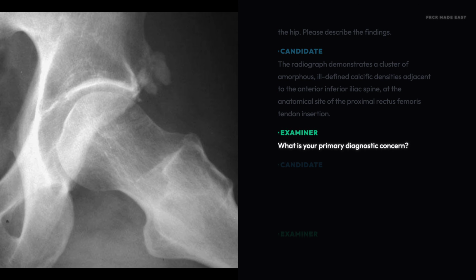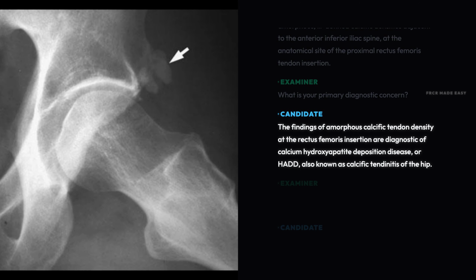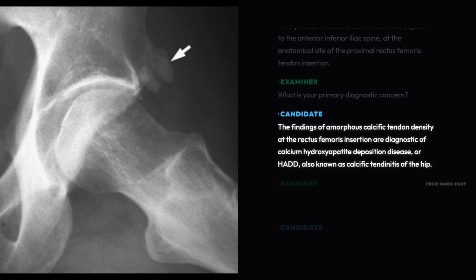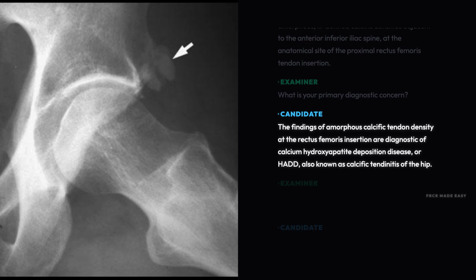What is your primary diagnostic concern? The findings of amorphous calcific tendon density at the rectus femoris insertion are diagnostic of calcium hydroxyapatite deposition disease, or HADD, also known as calcific tendinitis of the hip.